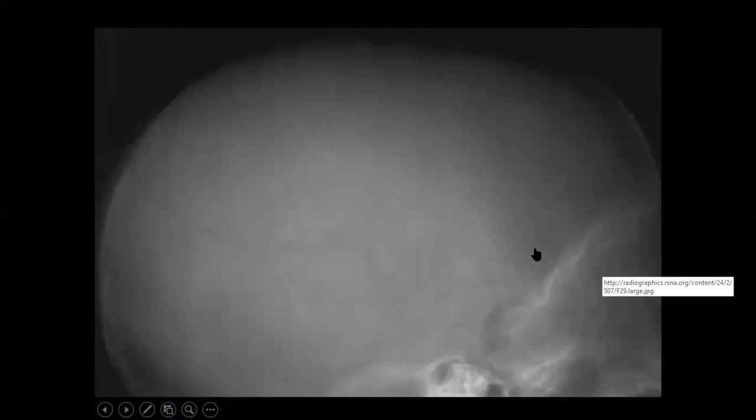What is LHH? What could this LHH be? Can you tell us? So Dr. Nermin, I don't know what this is, but I see many differentials. Okay, fracture, I am going to think about fracture, perfect. And it's good to think about growing fracture.